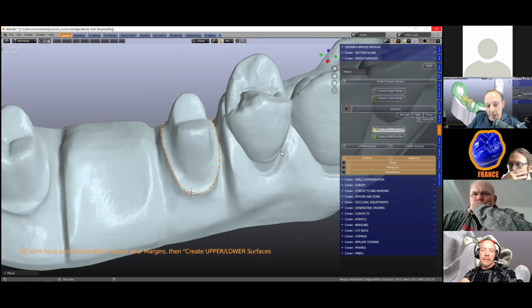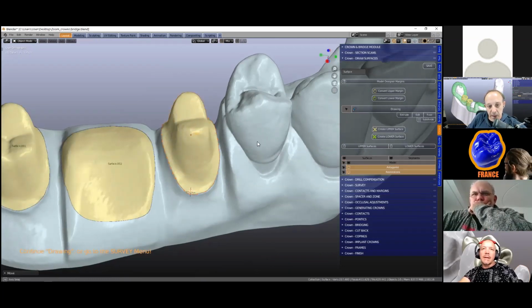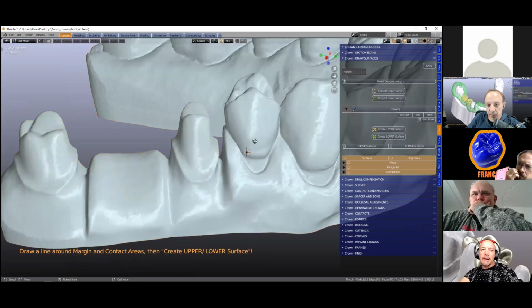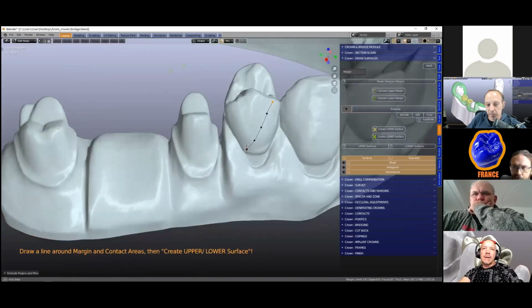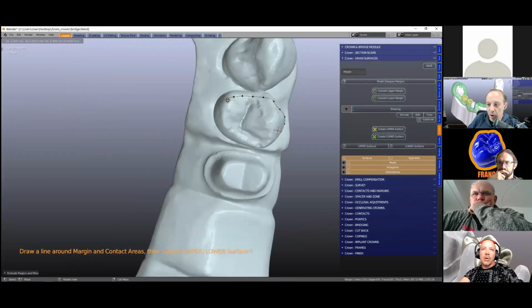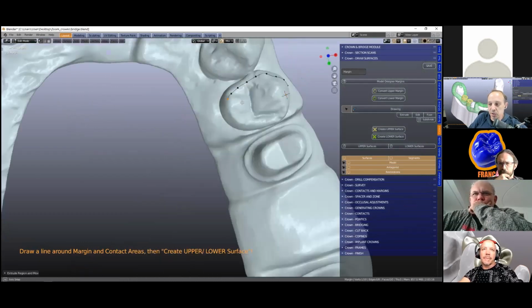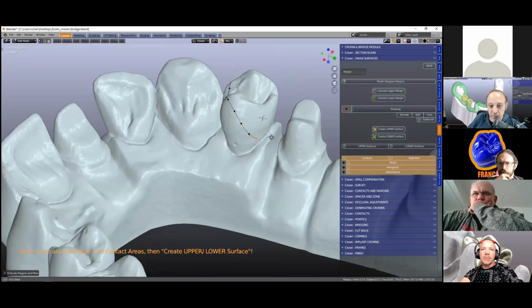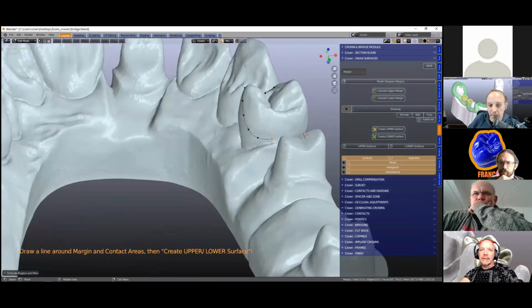Okay. And then the last one is the contact. Now, the contact is important because we need to make a miniature model of the contact so that we can offset. Can you just troubleshoot that contact one? Troubleshoot that one, Michael. Notice how I angle it around 45 degrees.